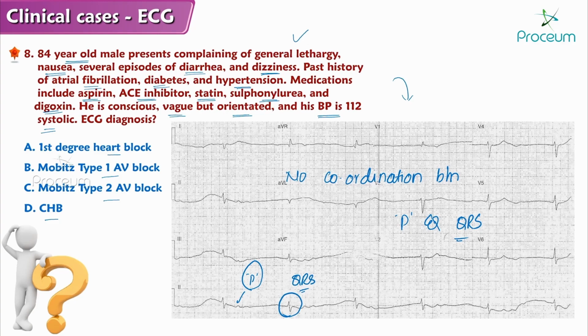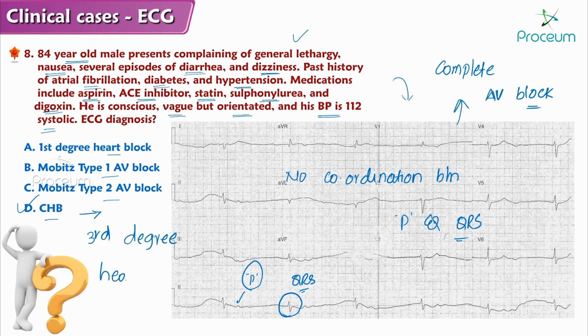This is a case of complete AV block, which is nothing but third degree heart block.